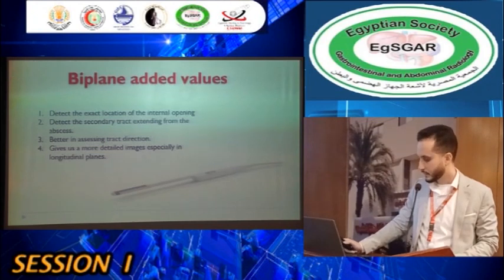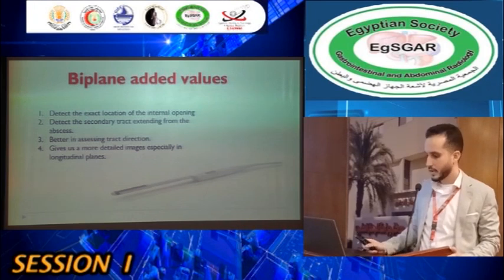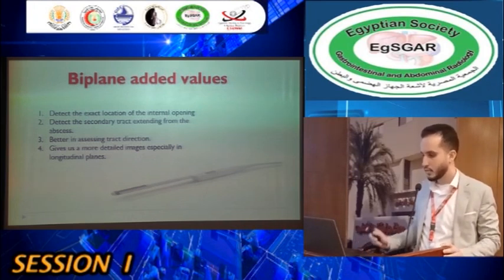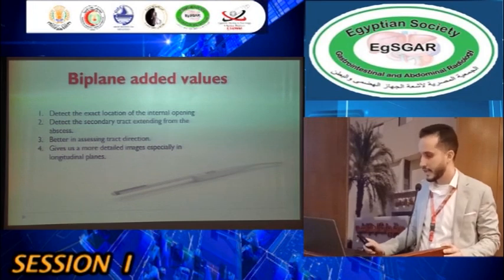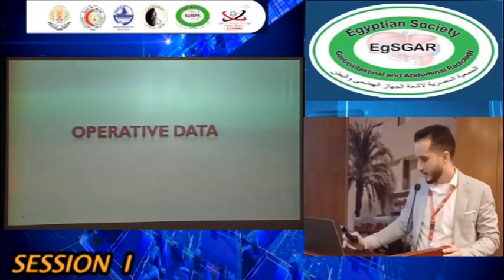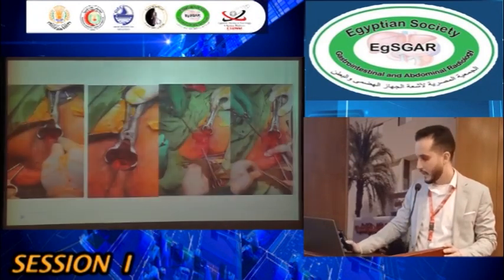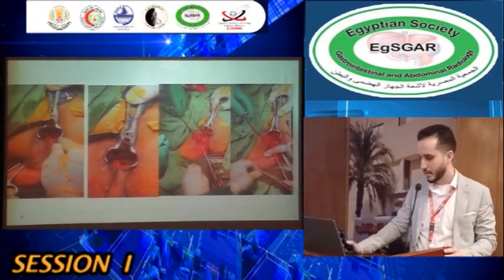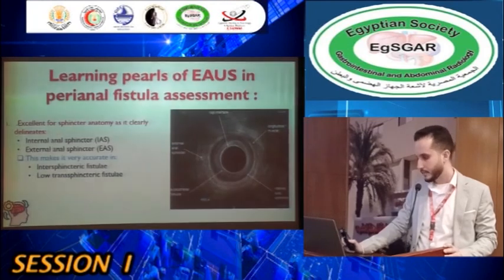In this patient, the biplane added value over 360 is that it allows us to detect the exact location of the internal opening, detect the secondary tract extending from the abscess, better assess tract direction, and it gives us more detailed images, especially in longitudinal planes. This patient underwent surgery 1 week after our examination, and these photos from the operation confirmed our findings.